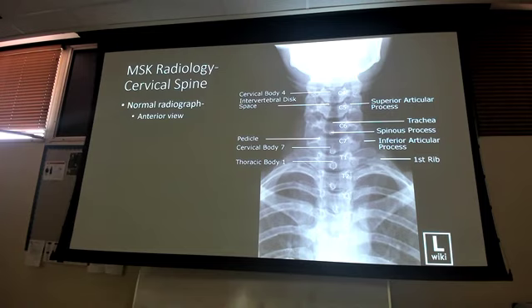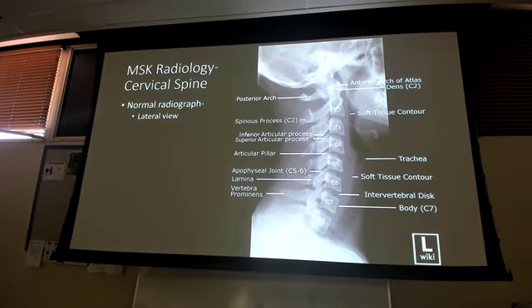These little bright white guys right here, these are your pedicles on the side. Got one labeled there. But this is your AP cervical spine x-ray. You're going to get C7 up to about C4, sometimes C3. It just depends on the patient. Aha! Now I can see all the way C1 through C3.